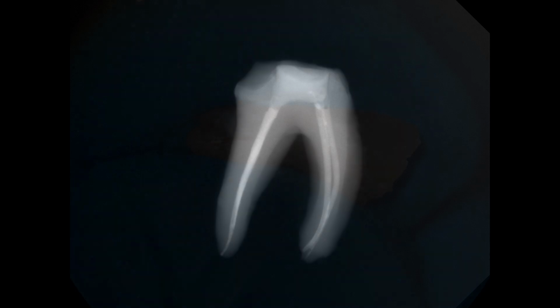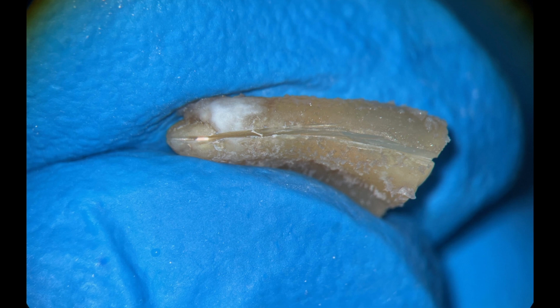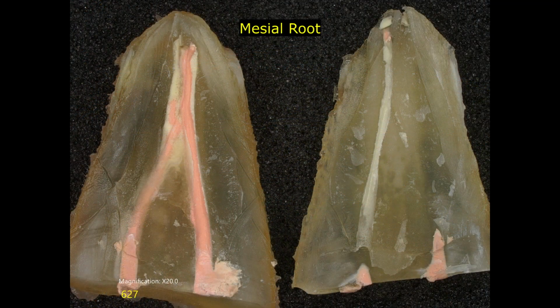Following our protocol, the crown was sectioned off, the mesial and distal roots separated, and each root split sagittally. The mesial root was split into two halves with the gutta percha staying intact in one of the halves. The mesial sagittal split was not ideal at the terminus, and only one half contained the canals to the terminus. The distal canal was similar in that one half contained the gutta percha intact for the entire length, but only one side had intact canal all the way to the terminus.